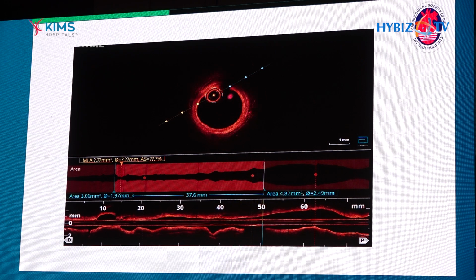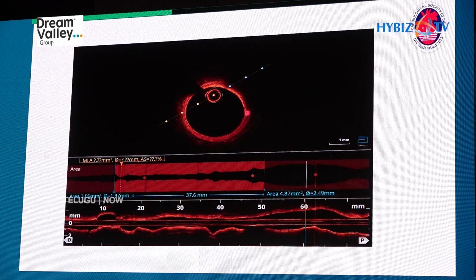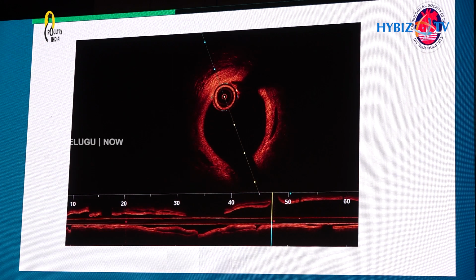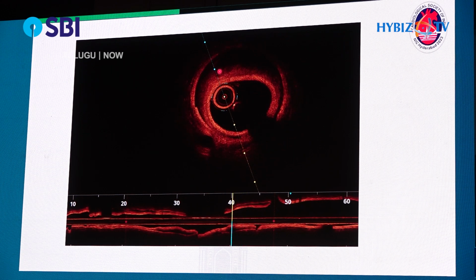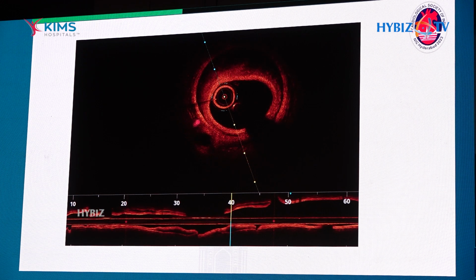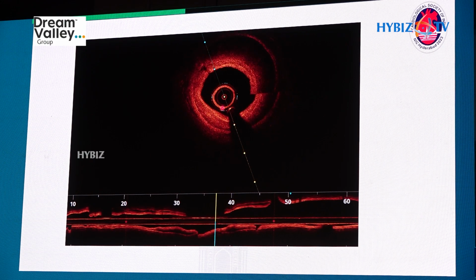There is no tear in the intima, but there is a separation between the intima and the hematoma in the media, because of intramural hematoma. You analyze the OCT, and it clearly shows the separation. This produces an image of diffuse disease on an angiogram, which is very important. Most of these patients can be treated medically, and there is no need for stenting looking at a lesion like that.